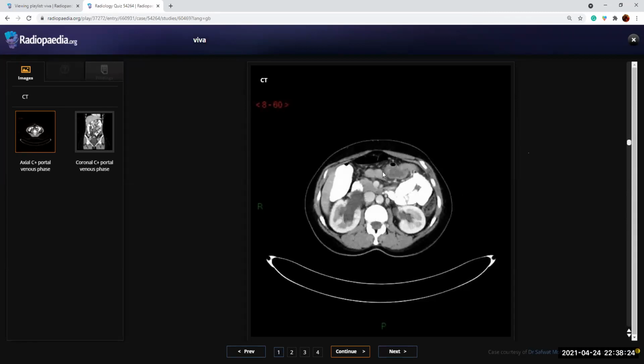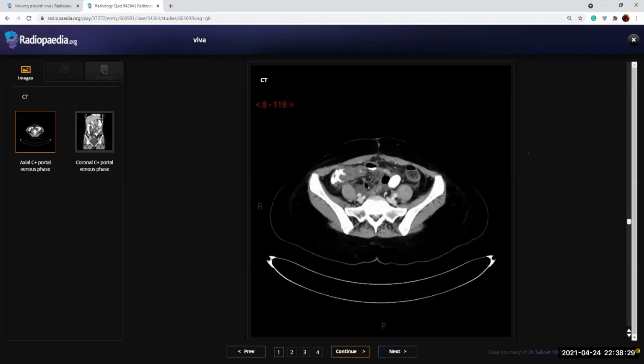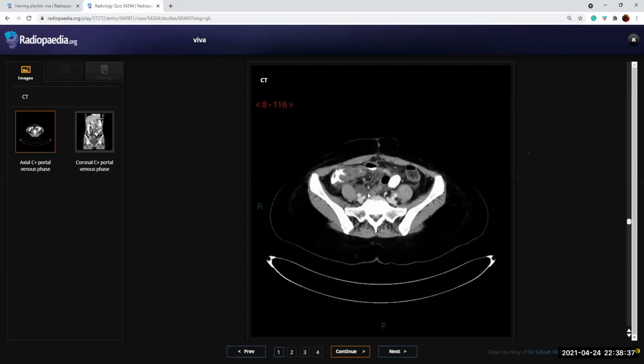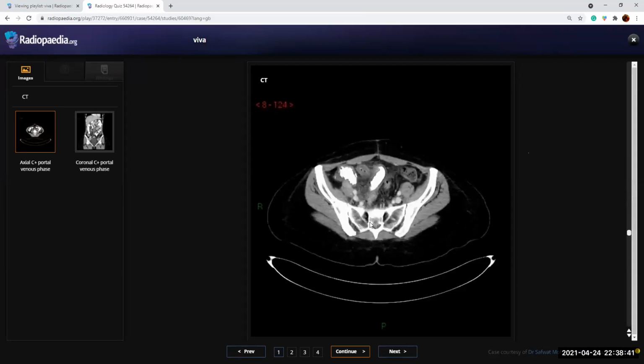You're suspecting something. You imagined it as Crohn's, but it's actually all around in the pelvis in the region of the radiation zone. Also, if you look at the ureter, it's dilated till it reaches this point. After that, it abruptly narrows. So that's also because of the radiation.